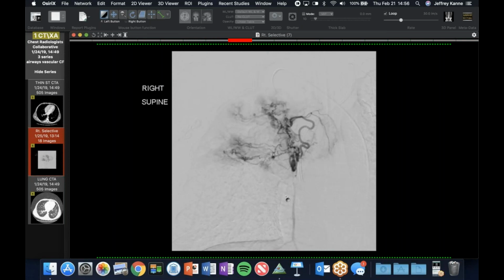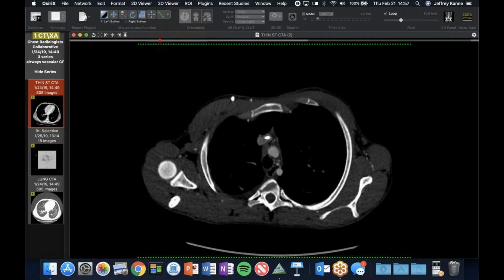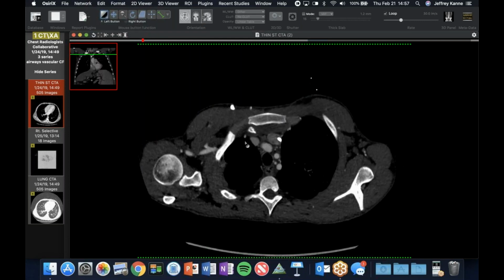Yeah, but what Travis is talking about is this vessel right there. I think, is that a spinal? That's too lateral, but see, it looks as though there's side branches. I don't know. Because that catheter almost, the course of the catheter looks like, is it engaging something in the ascending aorta, a bronchial? Or is this just a weird projection? Internal mammary, maybe? That's what I'm wondering. Yeah, they did a bunch of runs. I just grabbed the one that showed the best. I think they went off the internal mammary, and that's why it's so high. And that's what you're seeing there.